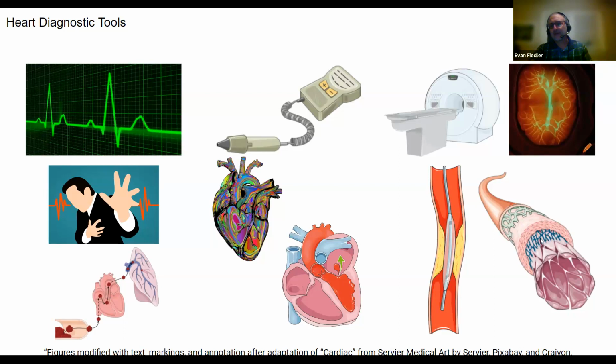And here we see coronary anatomy, and you can see the anatomy of a vessel, and we could see that with computed tomography, CT scan. We're taking slice images.